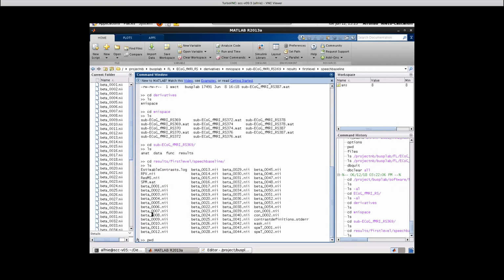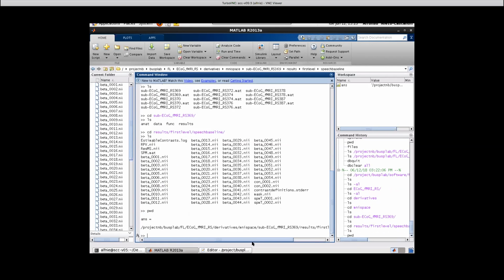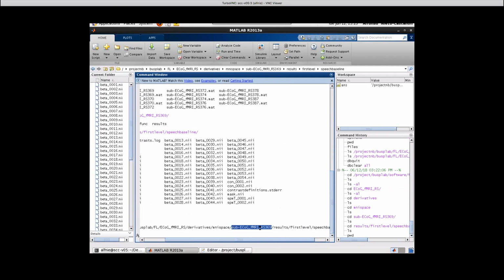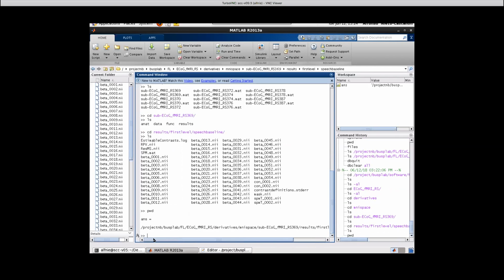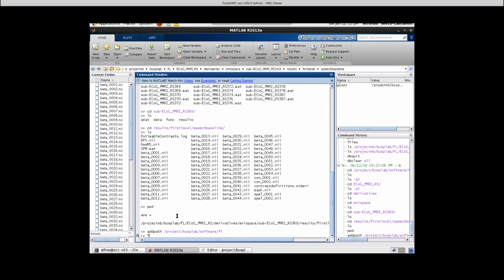So this is telling you that this data from this subject has been run through this pipeline and you have estimated this first level analysis. These are the different portions of the folder where the first level analysis results go. Okay, so if I wanted to check how well that did, the QA plots are in those. Okay, and if you have, let me just see, let me add.